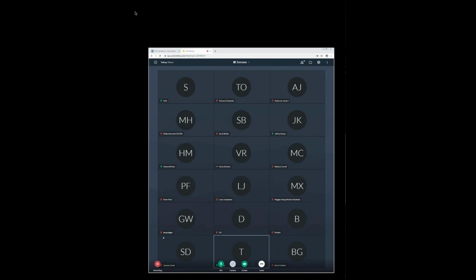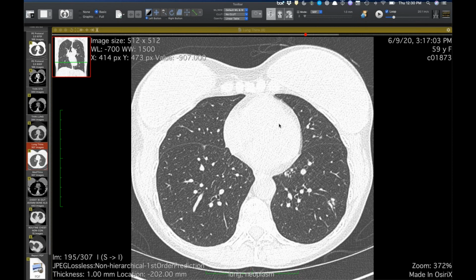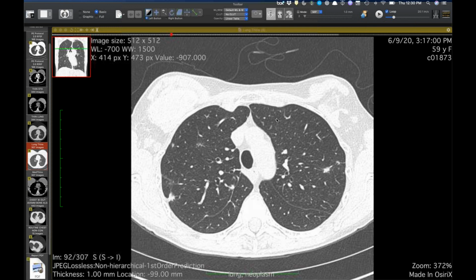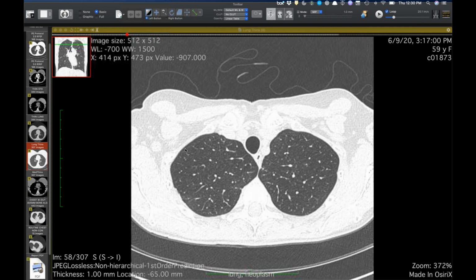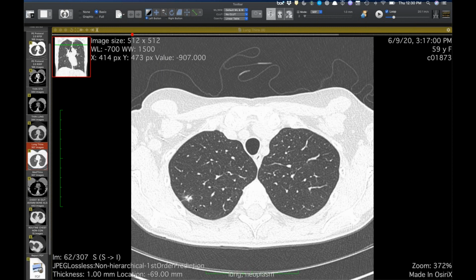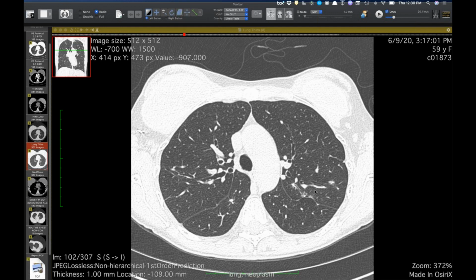And so remember, cath is an imaging modality. It's definitely the gold standard for imaging, but it's still an imaging modality and still read by people. You know, they make errors and miss stuff as well. So in this case, the CT was a little bit better than the cath, which usually is not the case by any means. But so it's a guy with Good syndrome with a thymoma who then developed post-radiation stenosis of his coronaries.